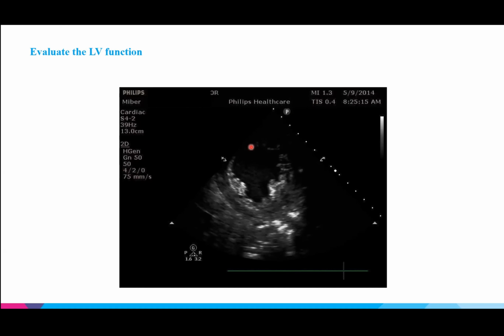Excellent, parasternal short. So again, when you see a nice circular left ventricle, it really is only parasternal short in terms of the point of care ultrasound views, right? And like I said, for LV function to likely be at least normal, you want the diameter to decrease by a third. And I would say in this view, it's barely moving at all, right? And really there's no change in thickness with contraction. So I would agree that this view is pretty standard for severely reduced.